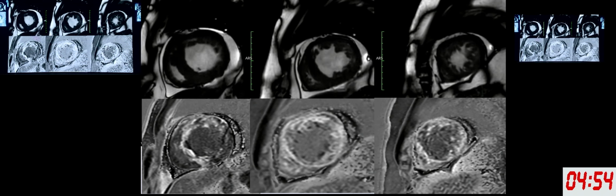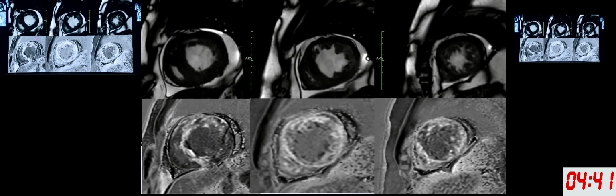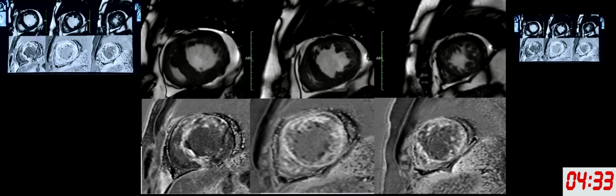Any guesses? Amyloid, okay. Anything else? Non-compaction, okay, there is a non-compaction component. HCM, okay, good. So you can see we all do not know what it is. We all disagree with each other. We will say what it is. This is Danon's cardiomyopathy. This is Danon's disease.